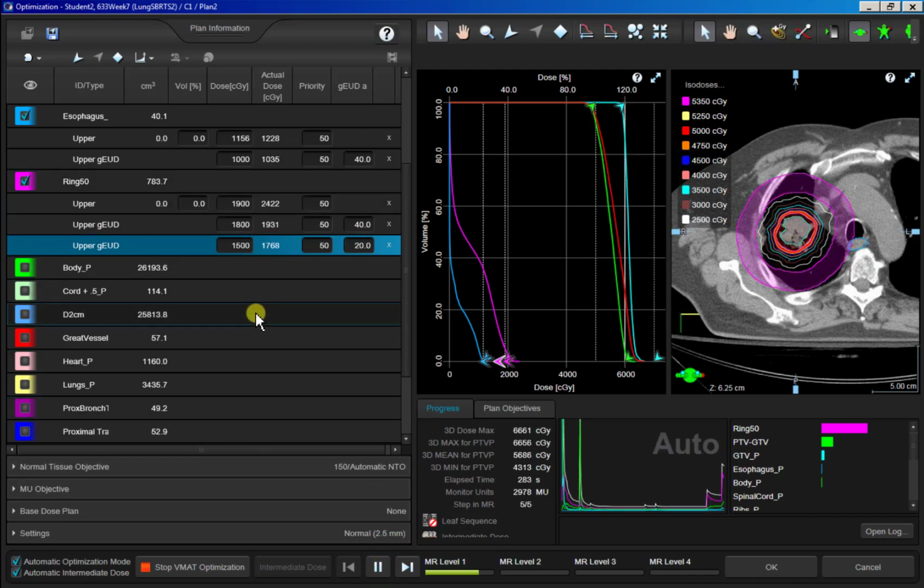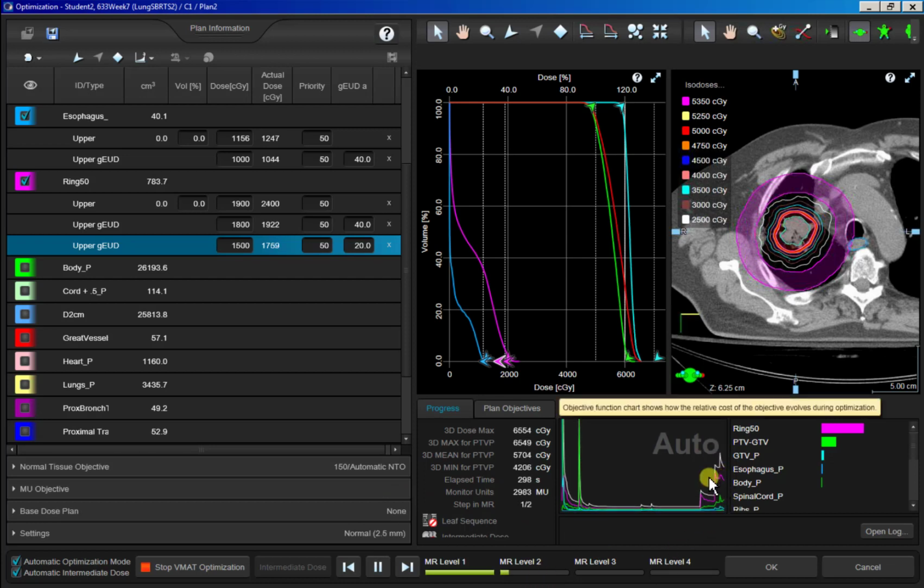That's about it. So now I am going to let this play out. Usually you don't have to pause or even touch it in any of these additional levels. Oh, I take that back. It's always a good idea to pause, especially if you see a big spike. Pause it. It's going to help you out. But we'll just fast forward through this.